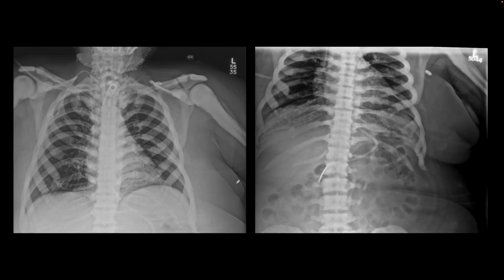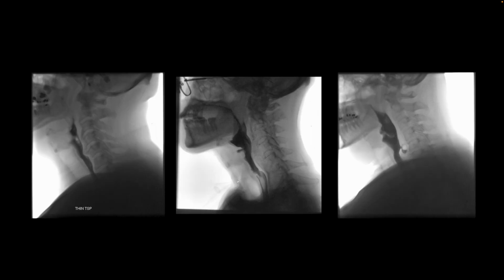This is our next patient. We are looking at plain films of the chest and the abdomen. The bones are very dense, and one of the causes of very dense bones is osteopetrosis. These are barium swallow images from 3 different patients showing different findings. Here we have an osteophyte, which is causing a mass effect on this contrast column going down the proximal esophagus.